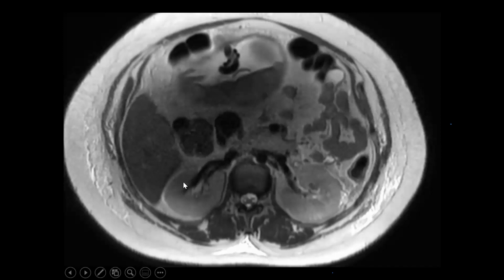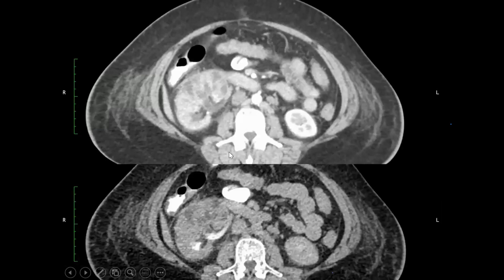Then again, this is the MR image, axial images, renal. On MRI, the vessels look dark because of the flow void. The normal vessels are dark as seen here. This is the normal right kidney, normal signal appearance on T2 weighted images. Why T2? Because the CSF is bright. This is a T2 weighted image. But on the left side, you can see a striated appearance, inflammation is seen. The signal is altered because of the left-sided pyelonephritis in this image.